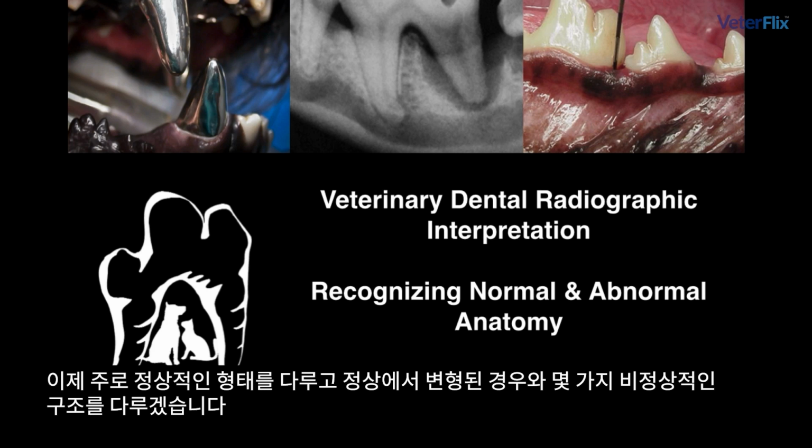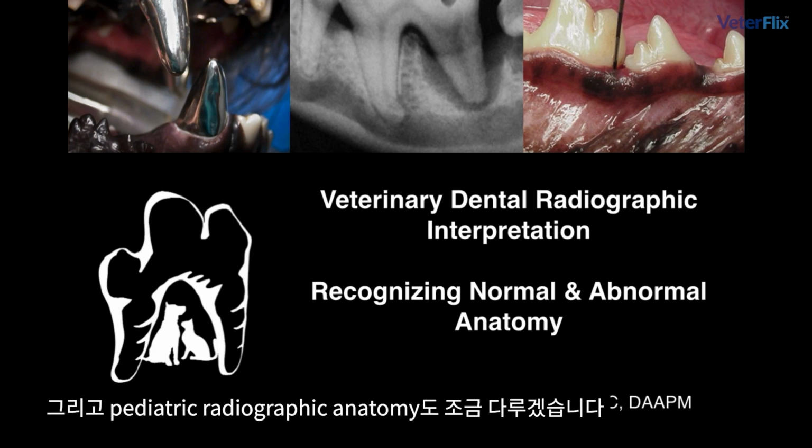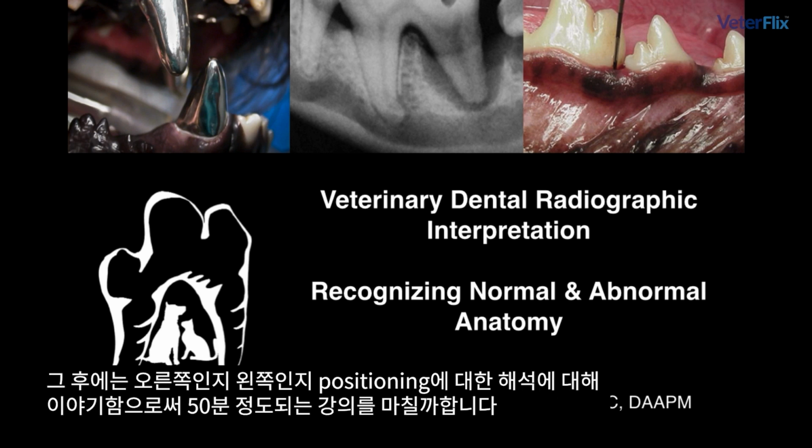We'll touch on some of the abnormal anatomy. We'll look at a little bit of a peek into pediatric radiographic anatomy, and then also talk about interpretation of positioning, right or left, and we'll finish up in 50 minutes to an hour, very likely.